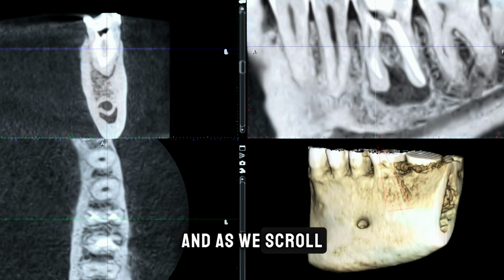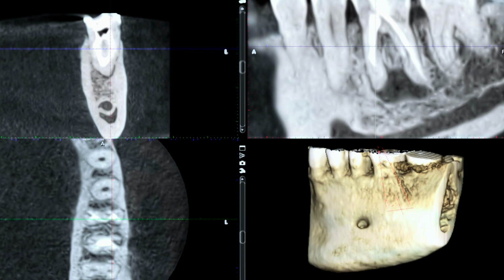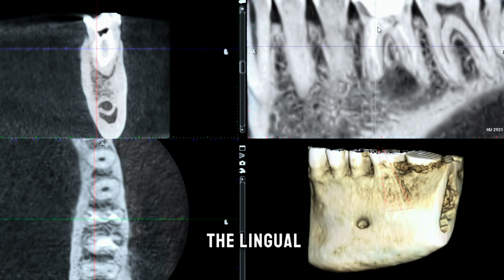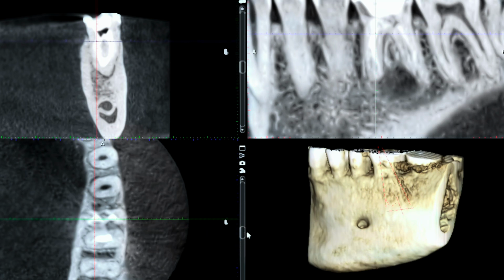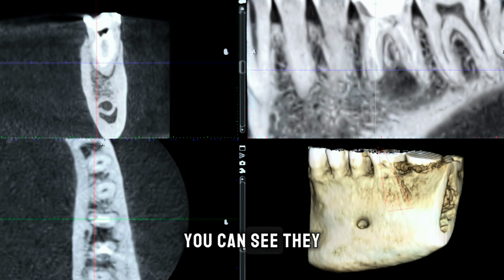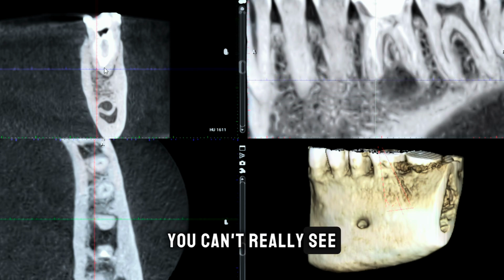As we scroll through here, you can see here's the buccal, and this is the apical extent, and then you can see it joins together on the lingual. If we look on this view down here, you can see we've got 2 separate canals, one here, one here. As we're scrolling down, you can see they join together to make one canal. Past that, you can't really see any patent canal. So I knew that my work was cut out to gain patency on this.